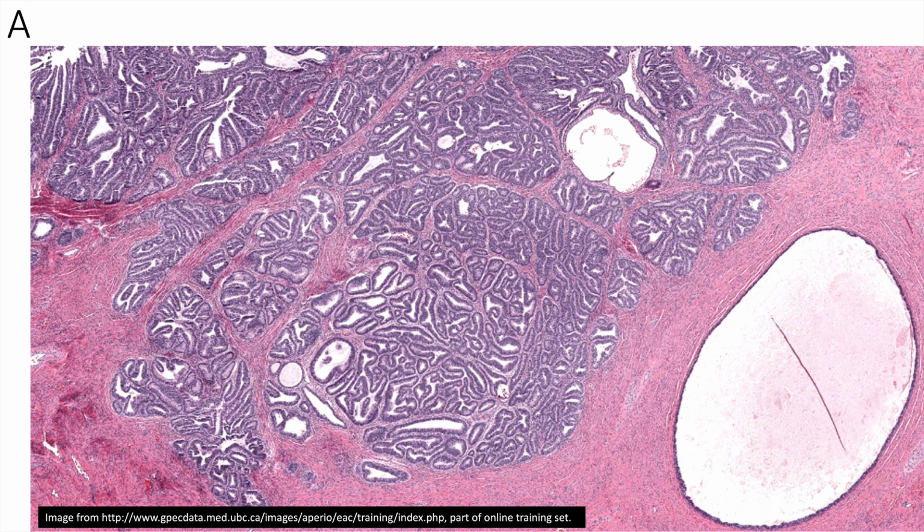So we'll start with pattern A. And some of these images are taken, as I've noted here at the bottom, from this website that is publicly available, and I will put a link to it at the bottom of the video. You can go here and actually go through these cases. Some of them are in the form of almost a quiz, so you can quiz yourself on these invasion patterns. But I found that they were very helpful, and I used some of them throughout the presentation.